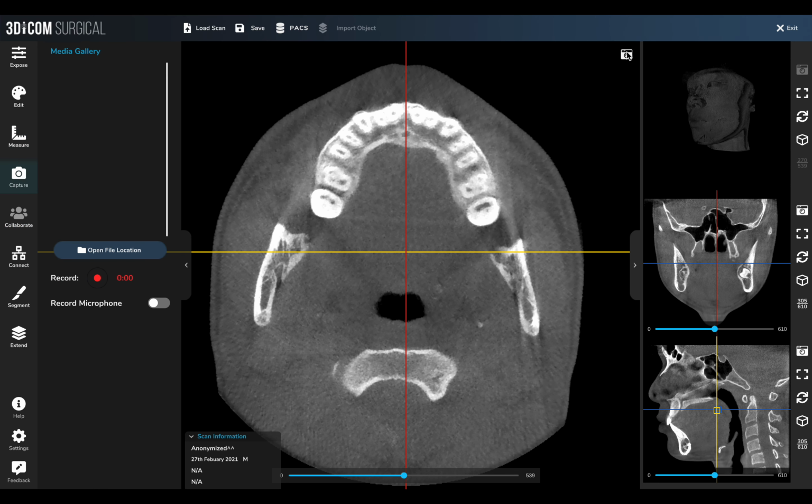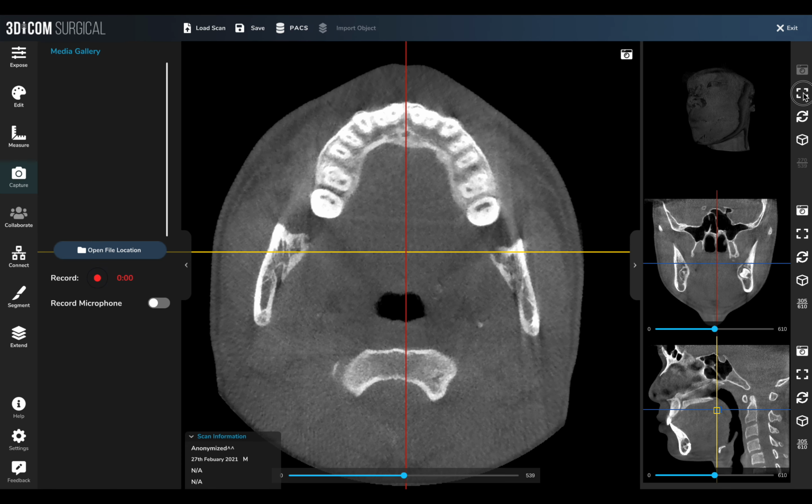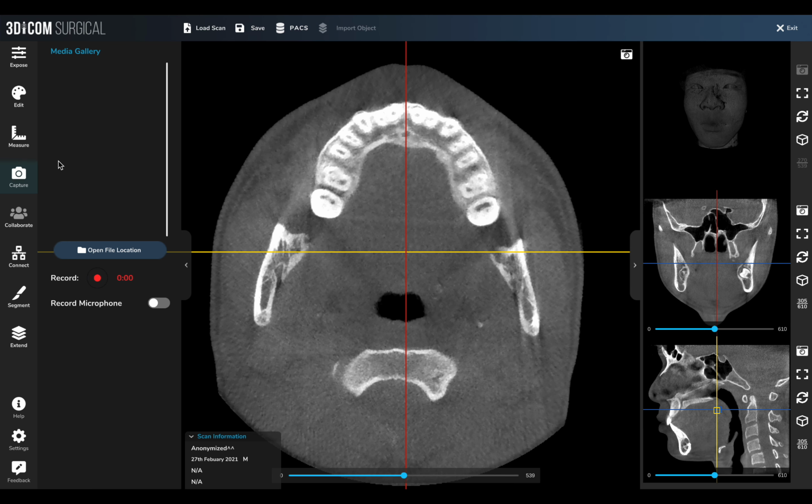The capture tool, the cameras now seem to be working. There's a fair delay from when you click the camera up there to when it actually takes the image. And there's a little bit of weird blur around the left hand side of the screenshots. Turning that around.